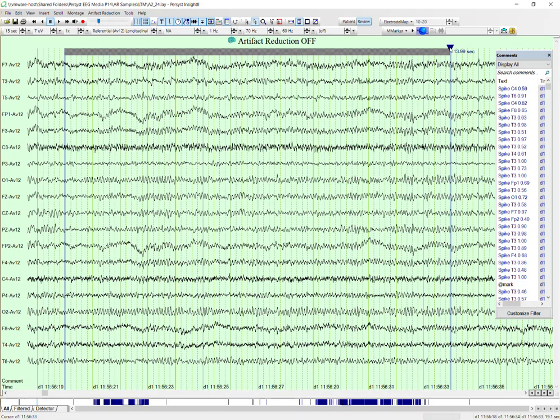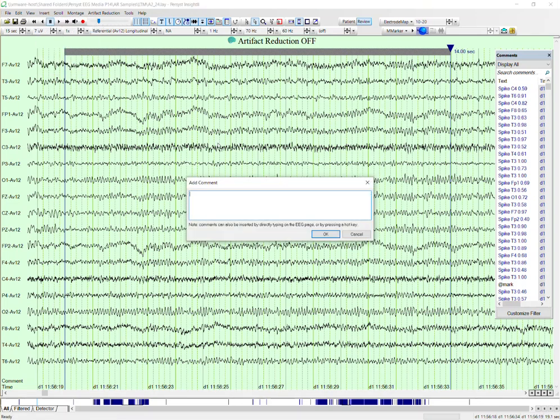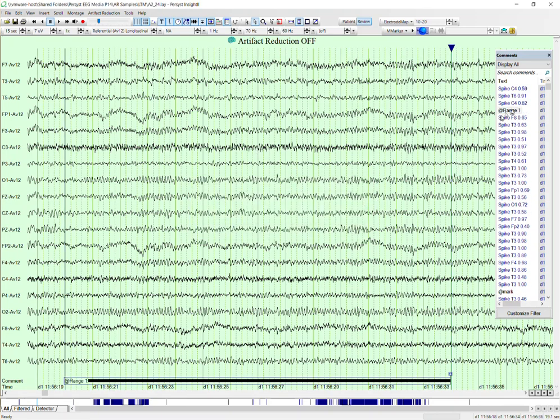Now the reason I mark this is I want to save the comment in the recording. So if I want to come back here and look at what I measured and repeat that measurement, it'll save this as a duration comment, and I can use that to define what I'm going to do for measurements within this. So Insert, Add Comment, and I'm just going to call this range 1, so that it's at the top of an alphabetized list. You can call it whatever you like, but I'm going to call this range 1. And there it is.